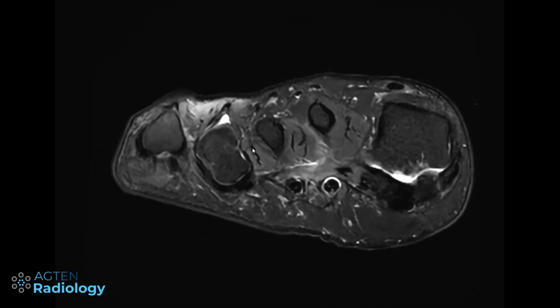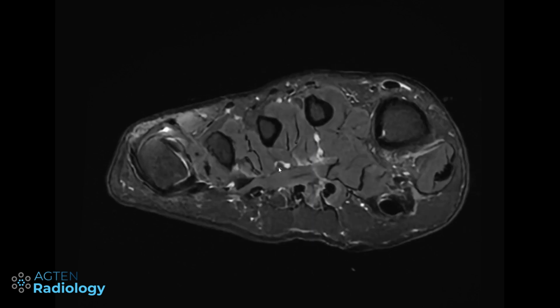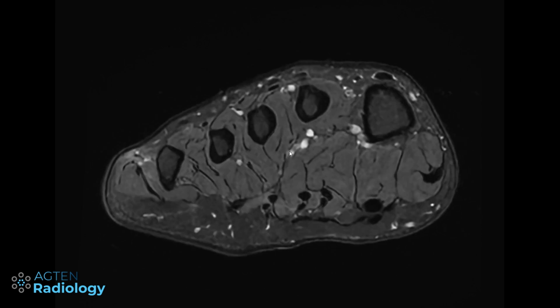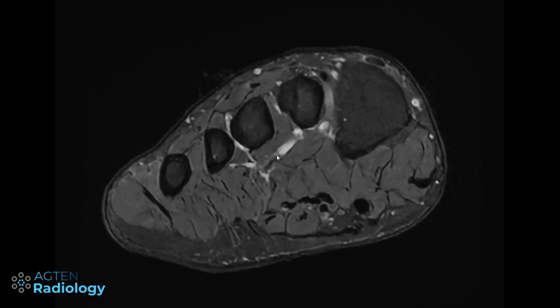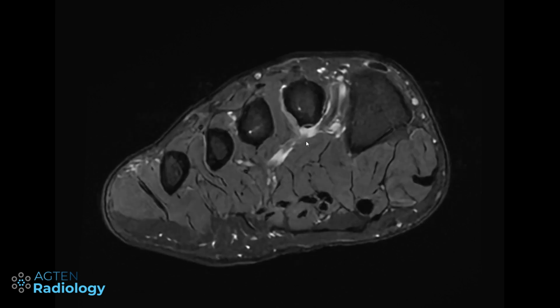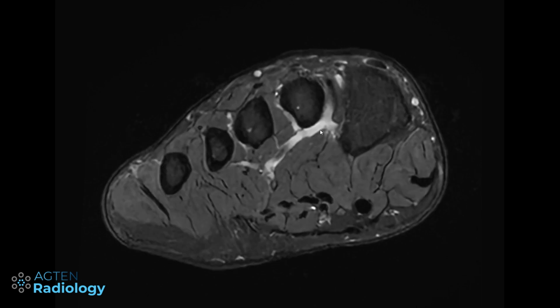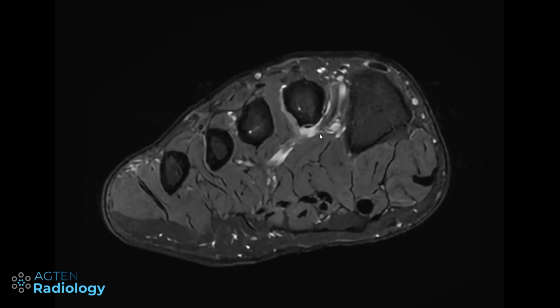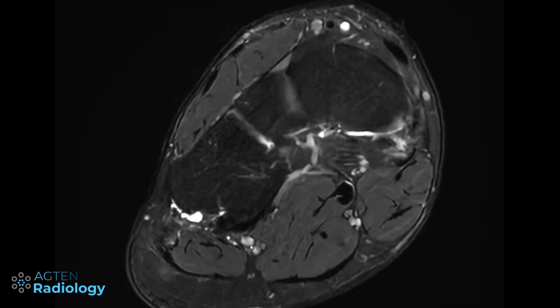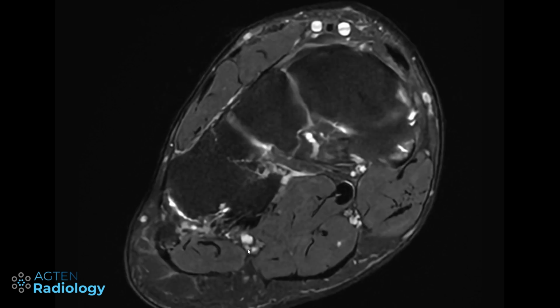We mainly should start looking at the metatarsal veins. We can see them here, maybe here, a little bit, depending on the phleboliths, etc. Difficult to see. Then they form the plantar arch, as we can see here. Sometimes we also have phleboliths, so it's something to keep in mind. But then that would be the plantar arch here, and from the arch, when we go proximally, they go into the lateral plantar vein and the medial plantar vein. So these are the two main components here.